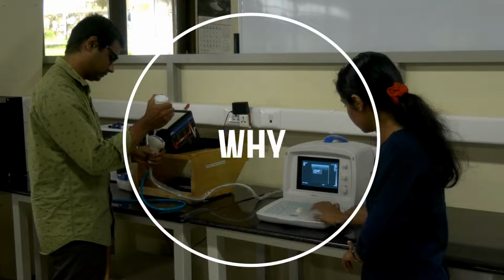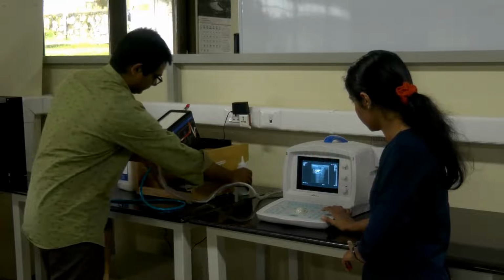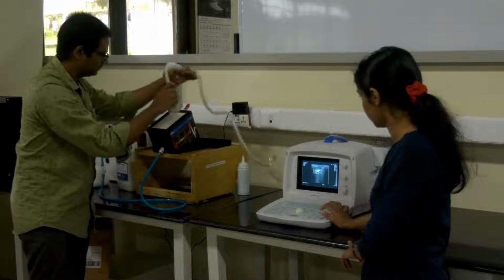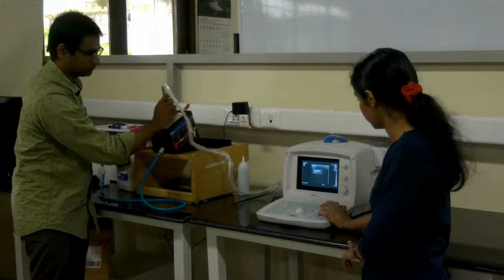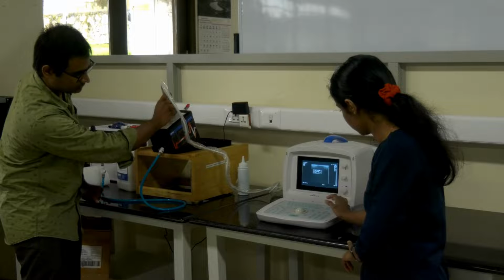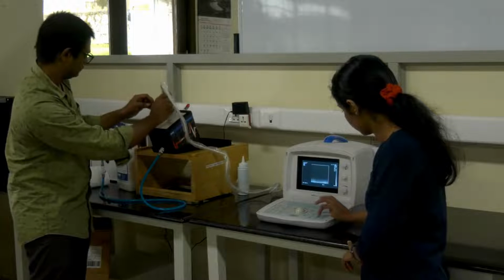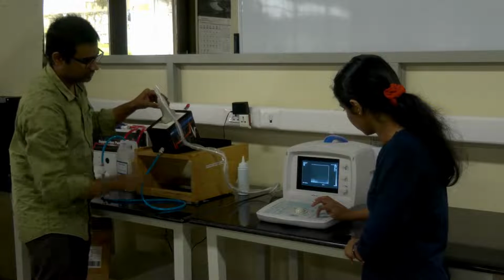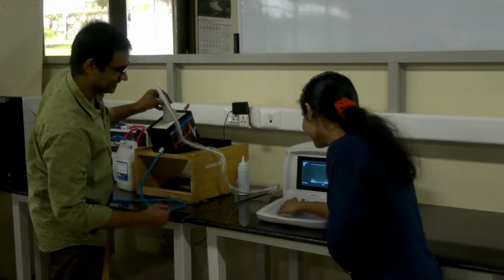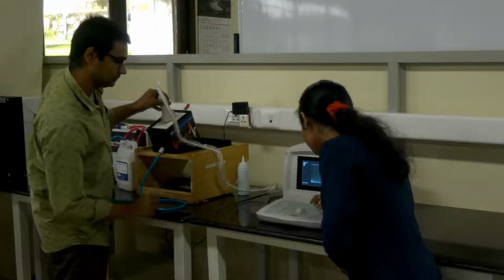So why automated lung ultrasound? I talked about the positives of ultrasound: being portable, easy to disinfect, enabling dynamic imaging, being non-ionizing, etc. But one of the most important drawbacks of ultrasound is that it's really not user friendly. It's heavily dependent on the expertise of the user taking the scan. One of the important issues, as you can see over here, is that ultrasound involves a lot of parameter changes while taking the scan. That means real clinical expertise is needed.